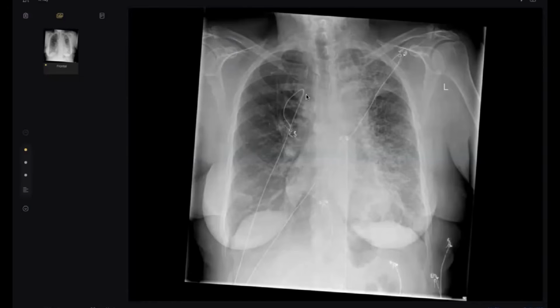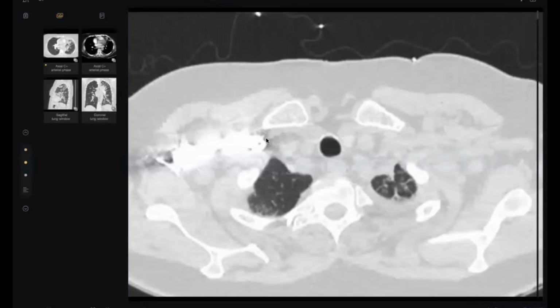Okay? The patient has a history of melanoma. Okay, what is your next step? This could be unilateral pulmonary edema or due to aspiration. Yes, unilateral reticulation like this may be unilateral pulmonary edema. Okay, but what else in a patient who has a history of malignancy? This could be metastatic deposits, early metastatic deposits.